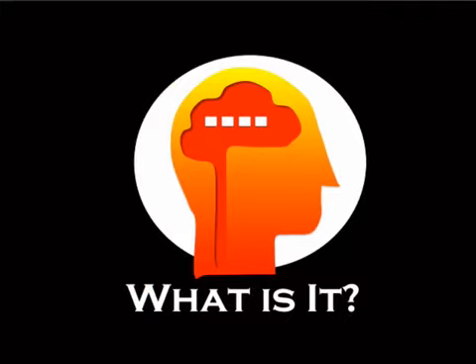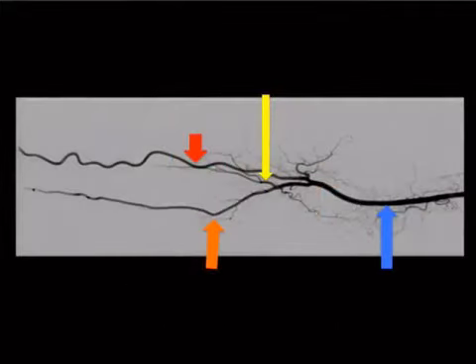All right, so next case, this is an arm. And just to orient you, thumb and fingers down here, armpit up here. So the first ones were coming down here. This is the brachial artery. And then it's going to bifurcate, and the radial is going to be on the radial side, and the ulnar is going to be on the ulnar side.